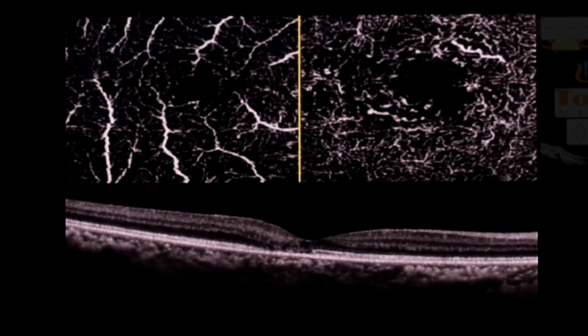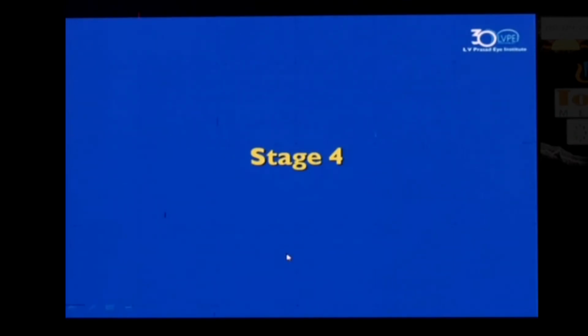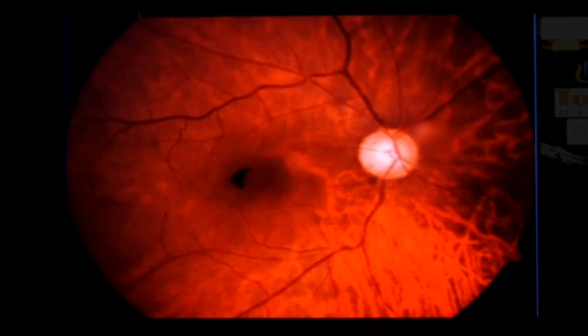On a regular OCT, you can see the ILM draping over the area where there's a loss of neuronal tissue, and then the outer retina dipping into the area of the retinal pigment epithelium, like what you can see here. Now, stage 4: another characteristic, apart from the perifoveal graying and dipping of the vessels, is the pigmentation. So RPE hyperplasia happens so distinctly.